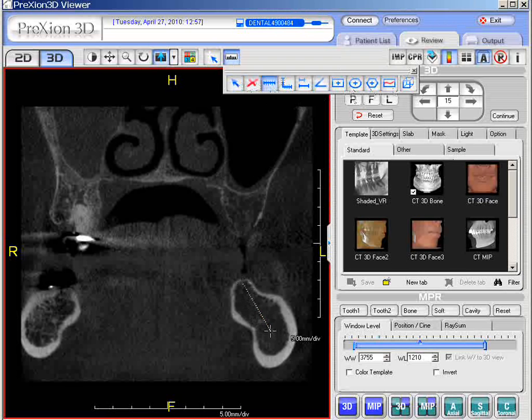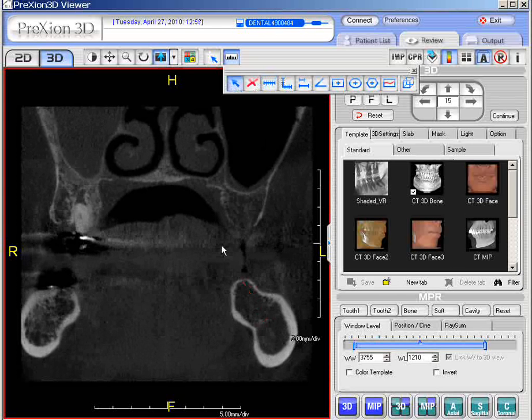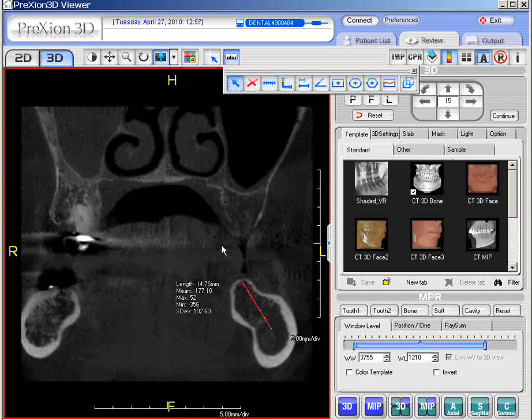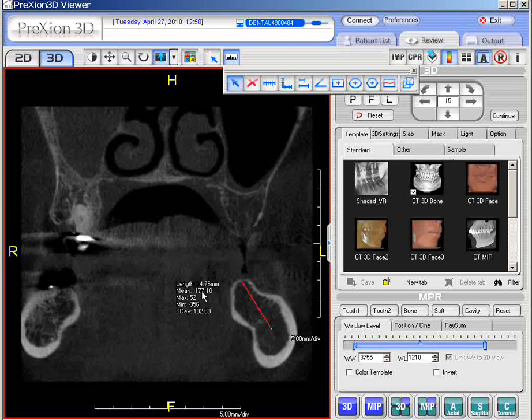Left click it, drag, and release. And let's say we want to keep that measurement on the screen. What we can do is left click the selection button, and then as we scroll back and forth, it maintains that frame that has the measurement on it. So as long as we keep the toolbar open and have the arrow in the selection position or neutral, we have this ability to freeze what we measured in that particular slice.